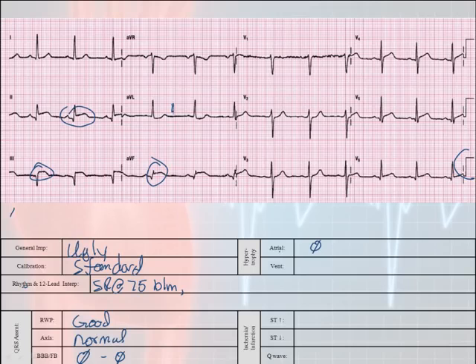Now, do we have 11 millimeters of R wave here? That's 5, 10, no. How about 12 millimeters over here? This looks like it starts on baseline, and that actually might be 12 millimeters. So it's possible it might be here. Possible 1. Left ventricular hypertrophy, and we don't have any right ventricular hypertrophy. The R wave needs to be bigger than the S wave, and it's not.